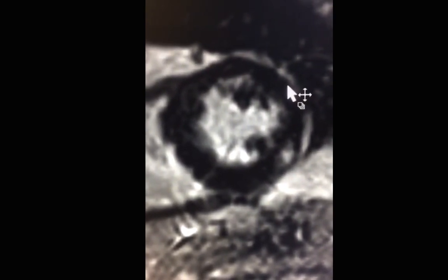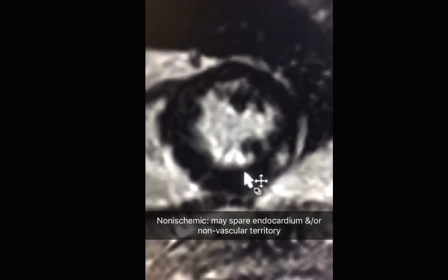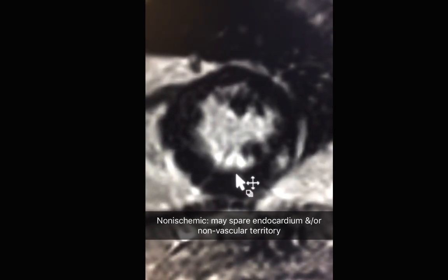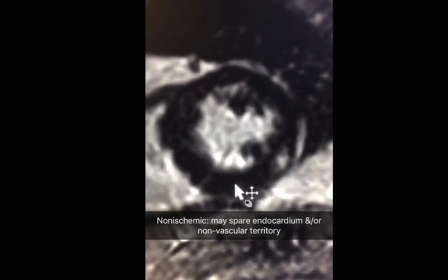That's compared to non-ischemic enhancement from, let's say, infiltrative disorders, where it's not sticking to these rules. So in cases of non-ischemic cardiomyopathy, such as amyloid or sarcoid or others, you'd have sparing of the endocardium or involvement in a non-vascular distribution.